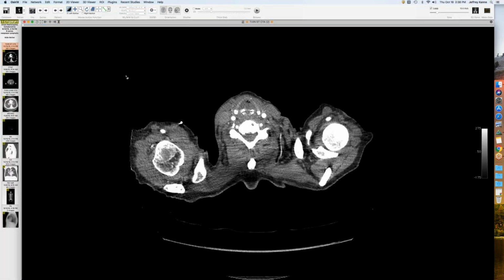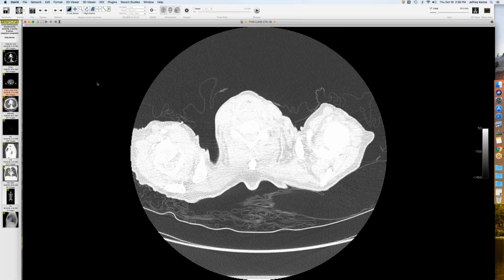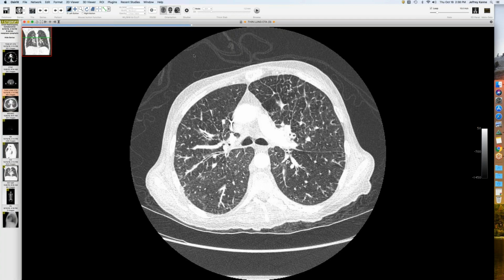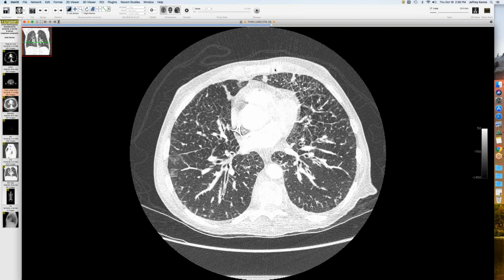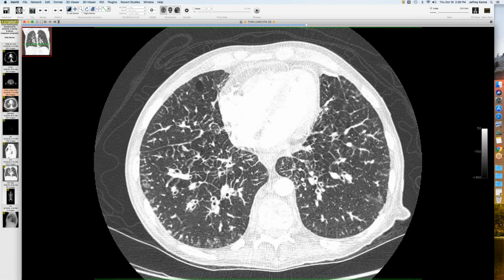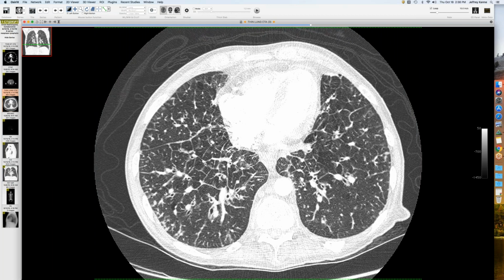All right, and then quickly, two cases of the same diagnosis in the same week that had normal-ish CTs beforehand. This is a patient who has a history of colorectal carcinoma, came in short of breath, and just has exquisite septal thickening. This is lymphangitic carcinomatosis, but it's interesting. I'm showing it because it has those lymphatic lakes or pearls that we've talked about in this conference several times. We always talk about them in the setting of lung edema, cardiogenic edema, but in this case, this is all edema because of lymphatic obstruction.